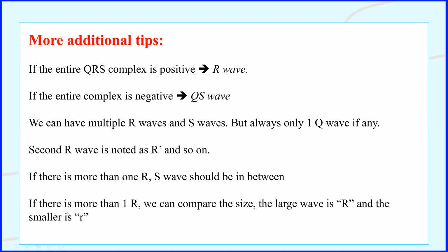And the last step here: if you have more than one R, you can compare the size of these R's. The larger R is written as R capital, and the smaller R will be called R small.